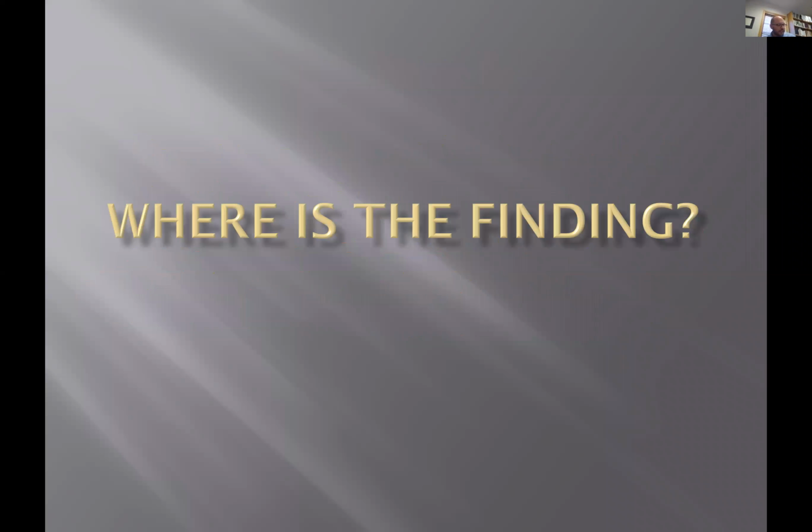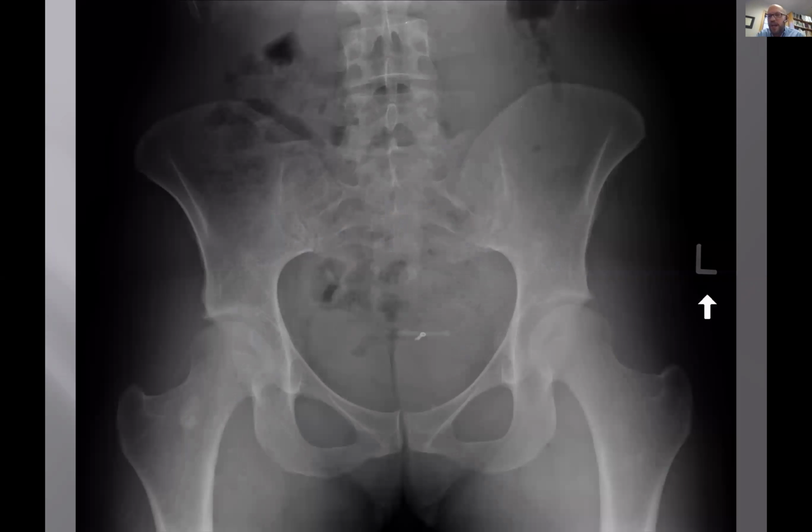All right. So with that in mind, of course, we want to start with where's Waldo? Just practice again with detection. So I admit the next couple cases are hard. They're hard to find the finding, but what I want you to do is chime in, go ahead, and if anybody, you don't need to even name your name, just tell me where the finding is. Of course, here's the left.